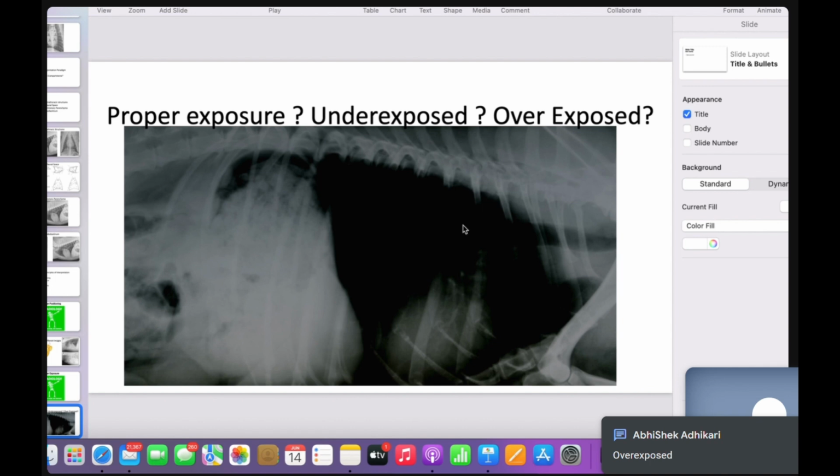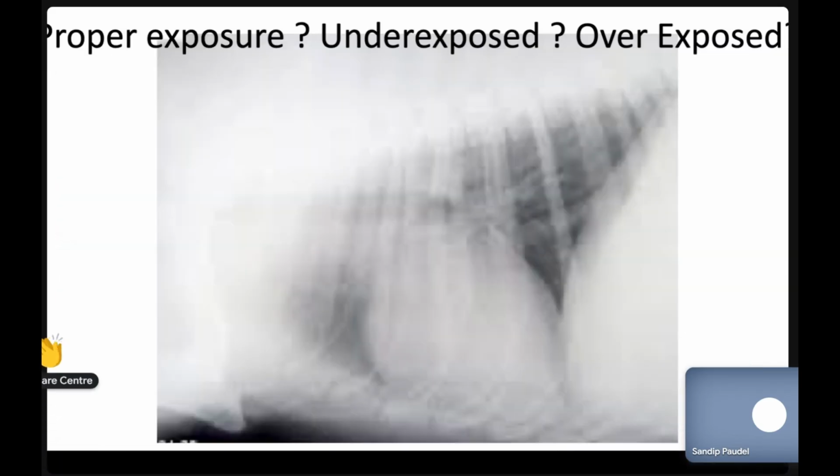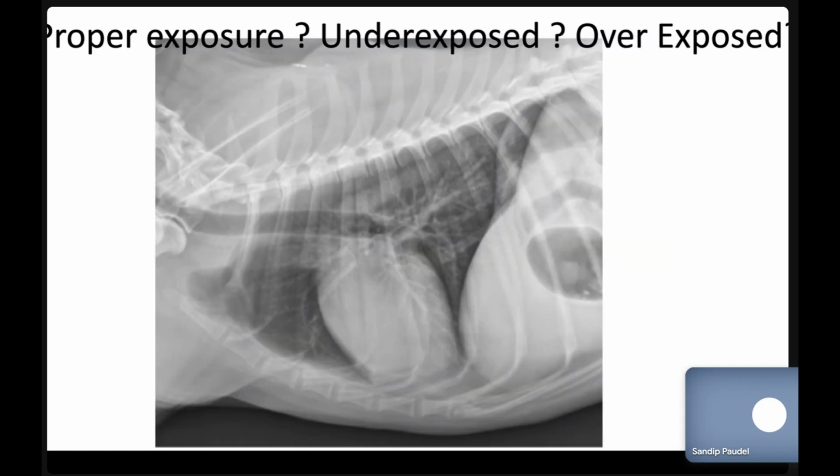In this X-ray, we can see it's more towards the black, so it's overexposed. I'm happy to see all those comments. Now let's move to the next. So definitely we can say this is underexposed, and now we can say this image is proper exposure.